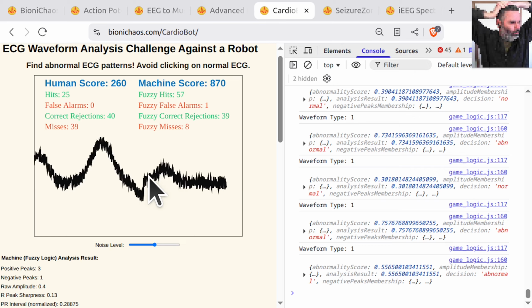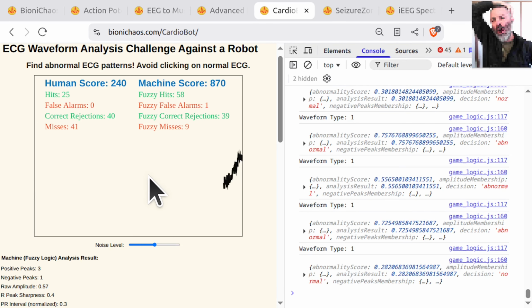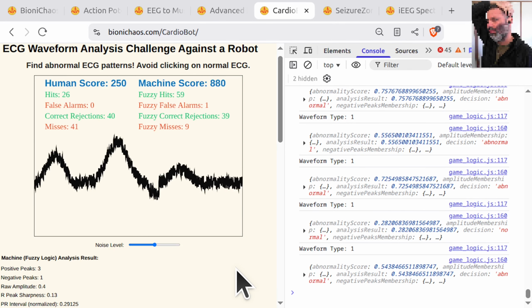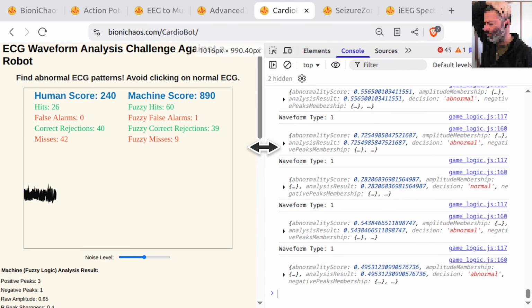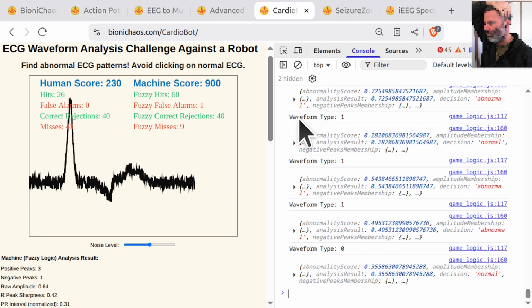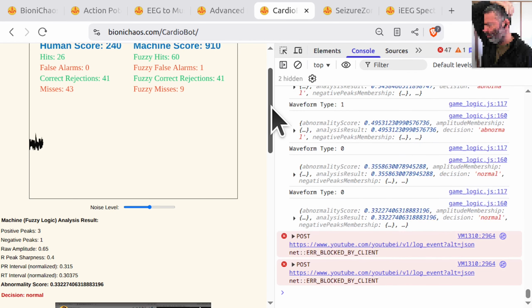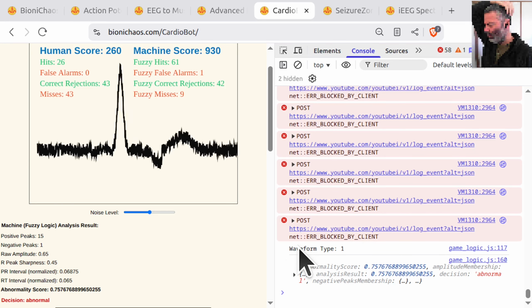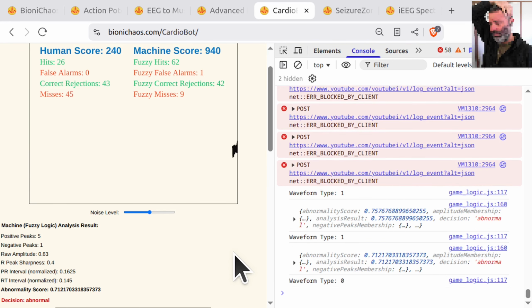So we have the counts of the peaks and the shape of the biggest peak. What's the final clue? Timing, the intervals. It calculates the relative length of the PR interval, the time it takes for the signal to get from the atrium to the ventricle, and the RT interval. These are normalized against the total length of the recorded strip. If those intervals are too short or too long, the heart isn't keeping pace, which is a massive red flag.